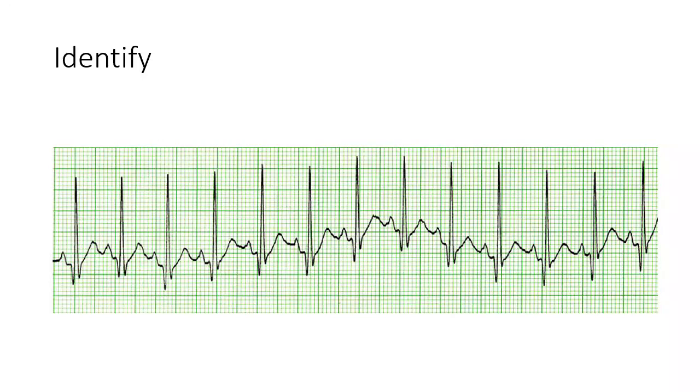Now, again, if you're thinking WAP or MAT, you got to have some drastic changes in the P wave. Because remember, when we went back to the other WAP that we had earlier, those first 2 I said, yeah, they look a little bit different, but they're close enough. So I would tell you that the P waves there, even though they're peaked, they look different, maybe than rounded. It's not close enough to be in the MAT category.